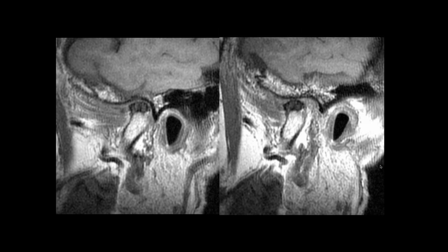Sam, what do you think of this one? I don't think I see a disc here. I think there's sclerosis in the head. Okay. So this is closed mouth. This is open mouth. Maybe there's a little kind of remnant here, but there's not much left. Whatever it is doesn't capture. We've got bone-on-bone articulation, and we have sclerosis of the head. Yeah. And this is the articular eminence, which is a little bit shallow here.